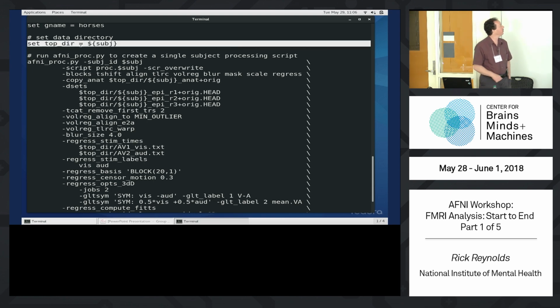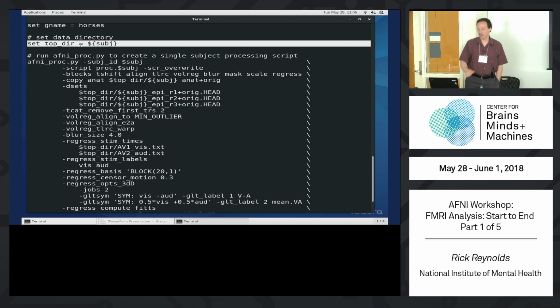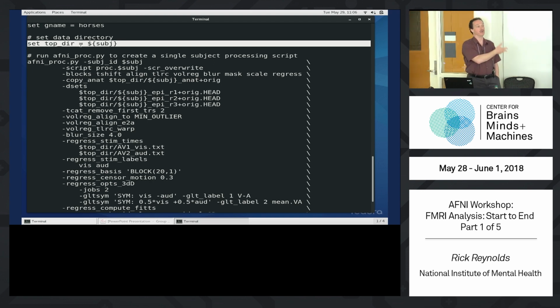We note a top directory where we receive the data from. In this case, that's just our subject ID FT. The data is in the FT directory. It's nice to do these sorts of things when you're writing your own scripts. Specify this is the top of my data directory. Underneath there, I will have raw data or whatever you have. So you'll have your paths and then subject directories under there. So organize your data, and then it makes writing these scripts very easy.